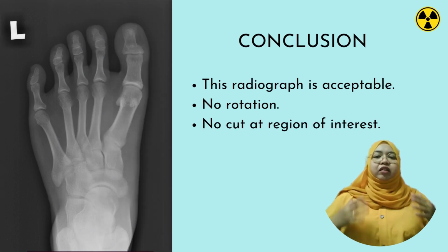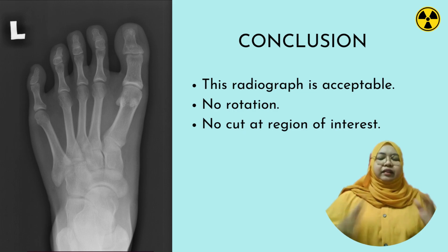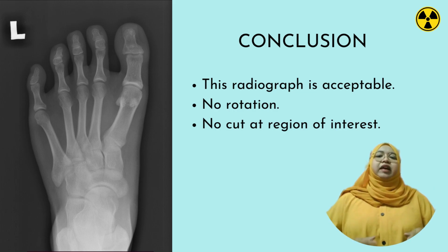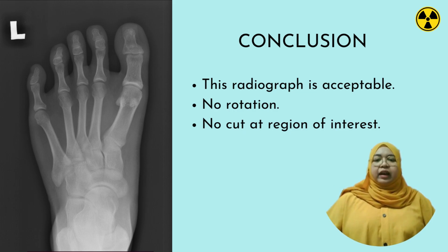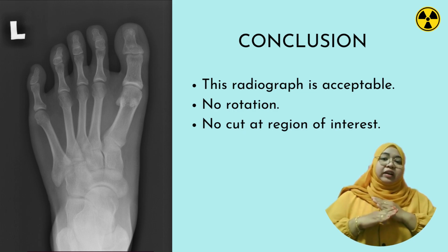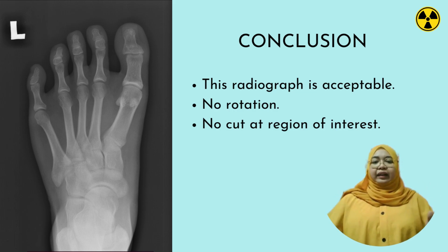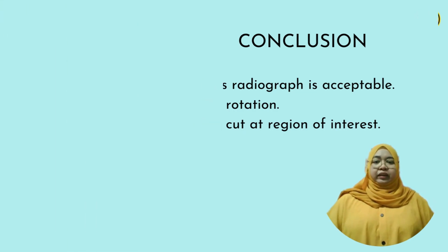So, for the conclusion, is the radiograph acceptable? Yes, this radiograph is acceptable. Why? Because there is no rotation, no cut at the region of interest, and also no evidence of artifact. Other than that, the exposure factor that we use is sufficient. So, for the conclusion, this radiograph is acceptable for me.